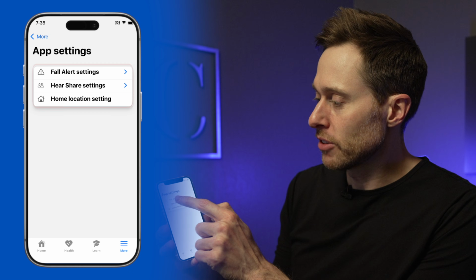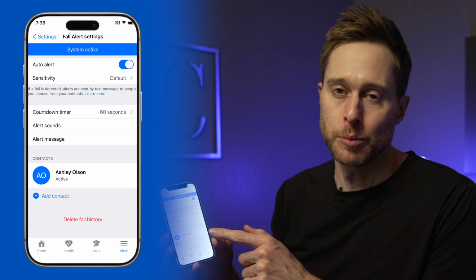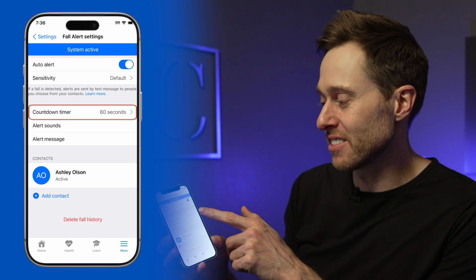For the fall alert settings, I actually have my wife Ashley set up to get fall alerts. Sometimes I like to prank her and just pretend that I've fallen with the hearing aids in my ears, and then she gets an alert after 60 seconds.